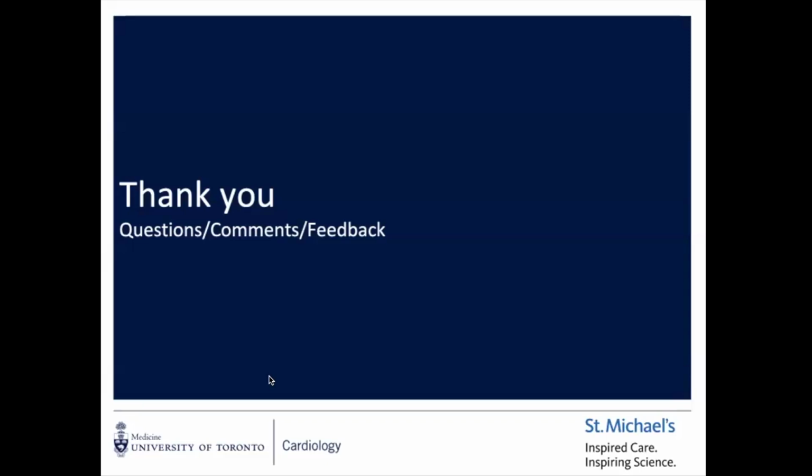If I'm scanning, would I say there is a change from the previous or no change from the previous? But then when you look at the images, they're kind of the same. So I think we just tend to spend more time on LV function, and we don't spend so much time assessing RV function.